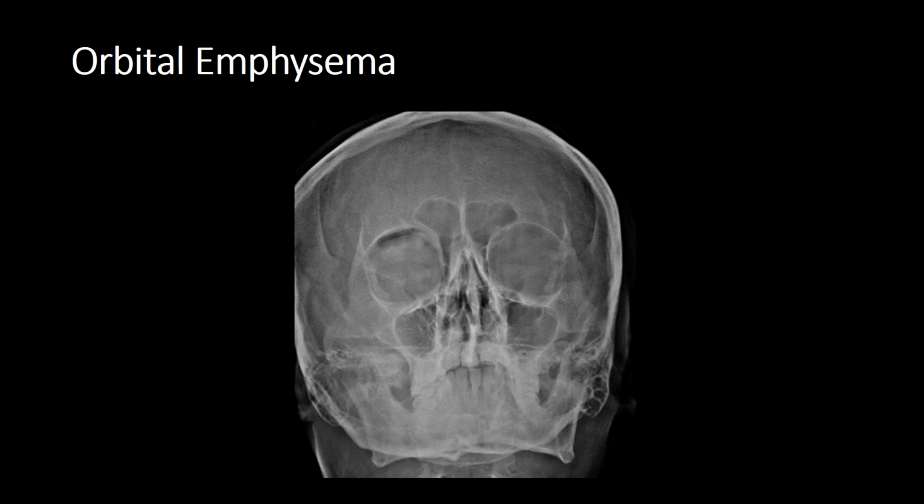But let's have a quick look at this X-ray. So A is adequate. Well, no, it really isn't, is it? It's really rather rotated, and the petrous ridges are quite clearly within the maxillary sinus. If this was me, I would definitely be repeating this image. But the purpose of this X-ray is to serve a function, so we'll just crack on.